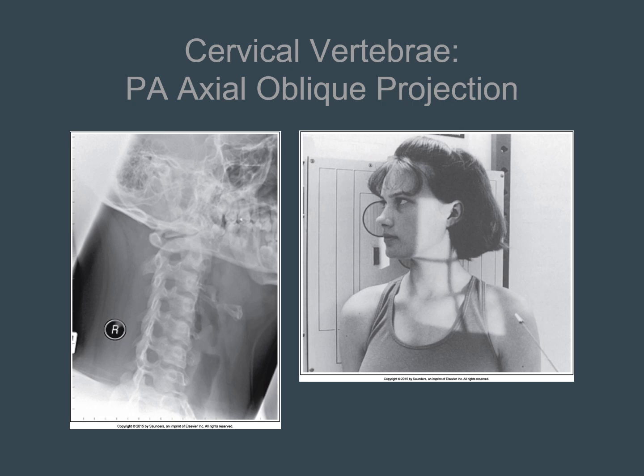In an RPO/LAO position, the left pedicles are demonstrated in profile, and the right pedicles are aligned with the anterior vertebral bodies. The inferior outline of the outer cranial cortices are demonstrated about a 1/4 inch distance between them.